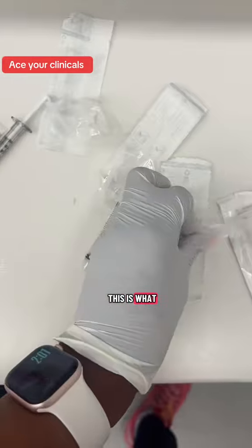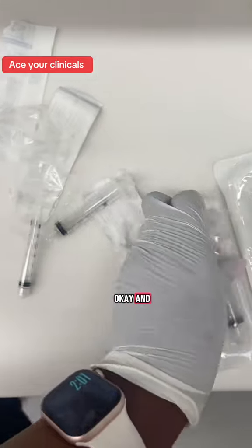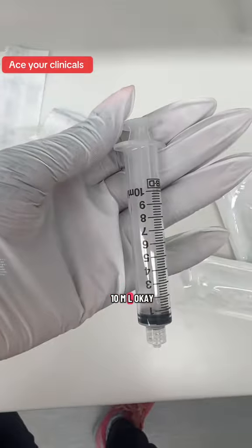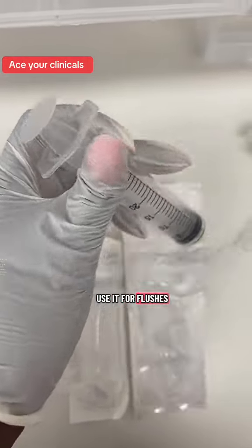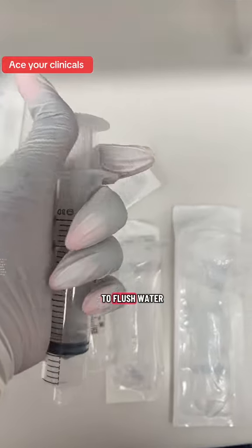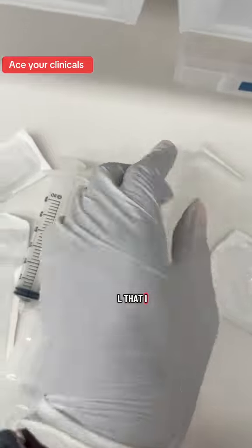And then this is what your 5 ml is going to look like. Okay, and this is your 10 ml. And then I told you about the 30 ml. You get to use it for flushes. I usually don't use it for meds, but for flushes when I have to flush water. And this is the 50 ml that I spoke about.